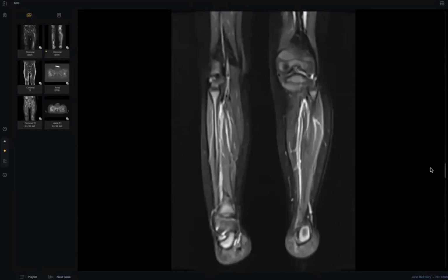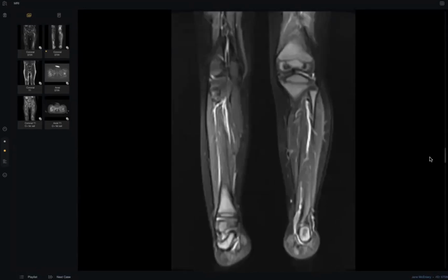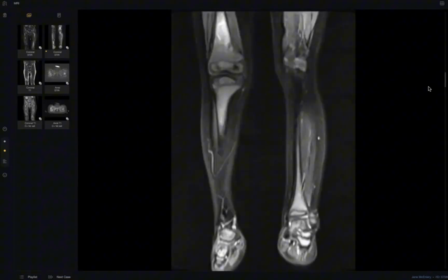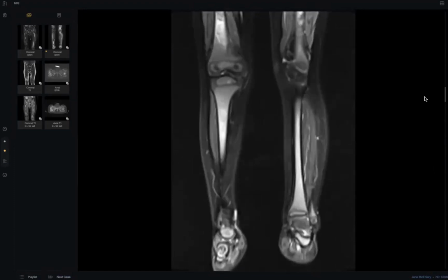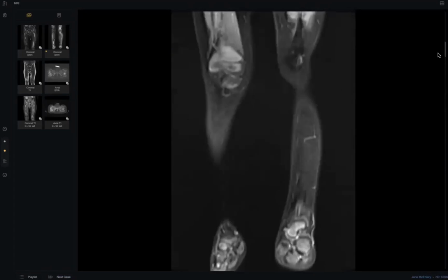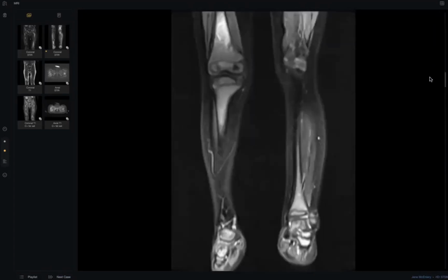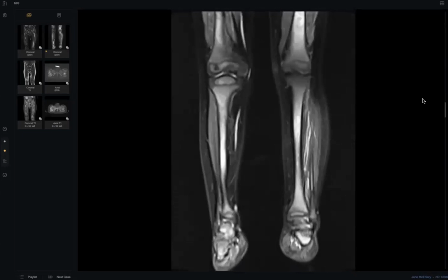The muscles, subcutaneous tissue, soft tissue appear to be unremarkable, and there are altered bone marrow edematous changes noted in the visualized bilateral lower femurs. I would like to review it in the axial images and further images involving the femur to confirm my findings.